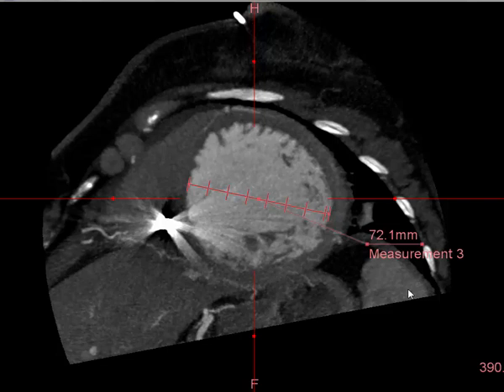So in summary, we have a 78-year-old woman who has what appears to be a non-ischemic dilated cardiomyopathy with no evidence of obstructive disease at the present time. She's got some mild pericardial thickening, and she has evidence of a biventricular pacemaker.